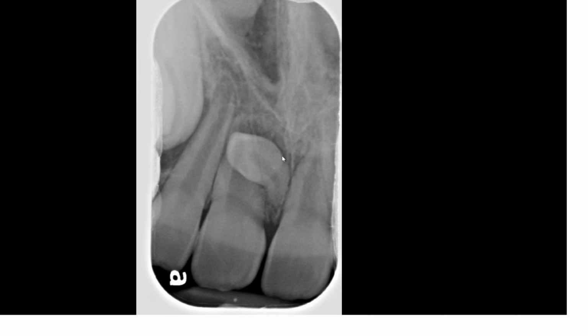So that was the point from the previous video, and the question is now, when you look at this, it looks almost inverted. It appears inverted, and there appears to be dilaceration, but as far as whether this crown is buccally pointed or whether it's facing palatally, we really don't know, right? And how severe is this dilaceration, if this is true dilaceration? So those are some of the questions that are still remaining. And so now let's take a look at the CBCT and find out what's the true position of this Mesioden.